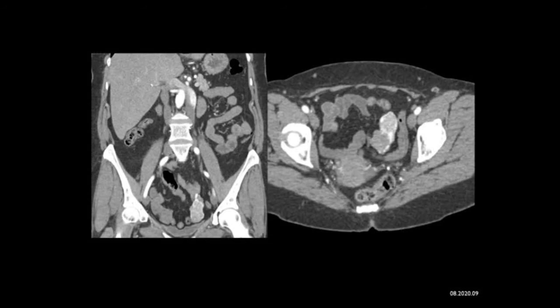One of the things about small bowel tumors, particularly GIST tumors, they grow exophytically, and sometimes you really don't recognize where they come from. Lymphomas are solid masses, can be multiple, with various appearances in the small bowel, but they do not enhance. Adenocarcinoma, infiltrative, can be bulky, but again does not enhance.